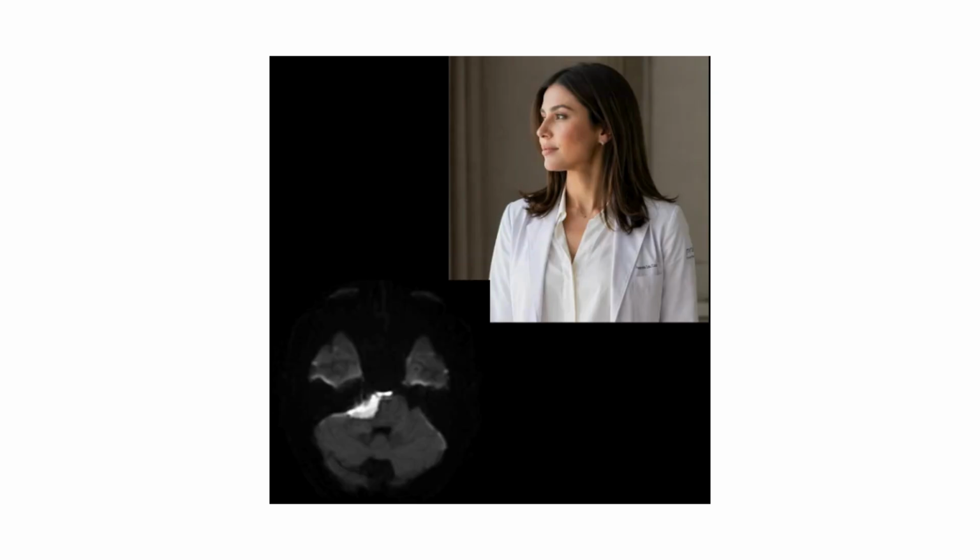The plot twist: the epidermoid, a wolf in sheep's clothing. Just when you think you have it narrowed down, you see a lesion that looks like cerebrospinal fluid on T1 and T2. Is it an arachnoid cyst? Not so fast. Key teaching points.